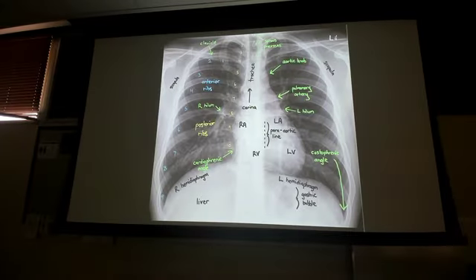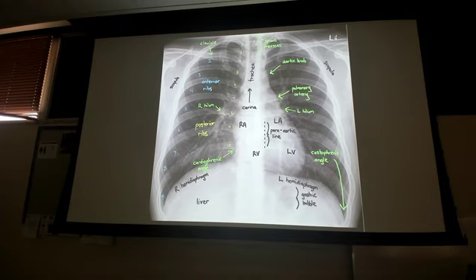This guy? Yeah, the green dashboard is to the left. Oh, the cardiophrenic angle? This is just where the right atrium ends up going into the lung areas. The costophrenic angles are where the ribs and the lungs come together. The right atrium can sometimes form that little angle in there. It's nothing we really discussed in detail, so I wouldn't worry about it too much as far as the test goes on Tuesday.